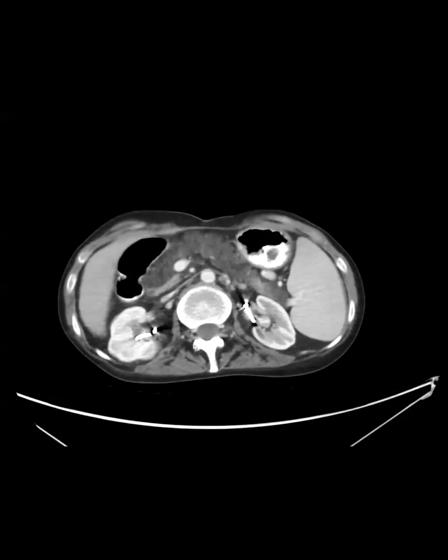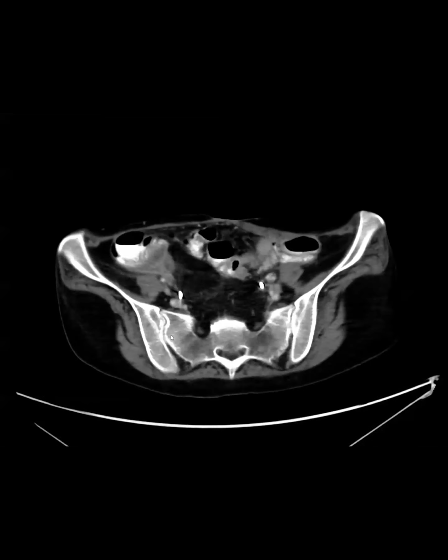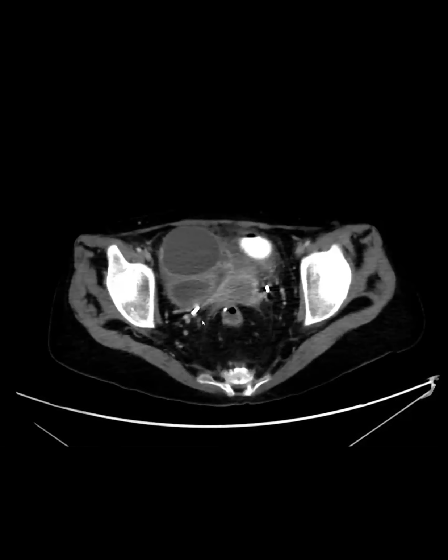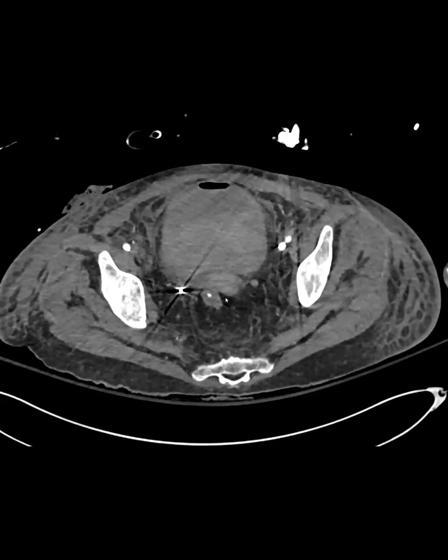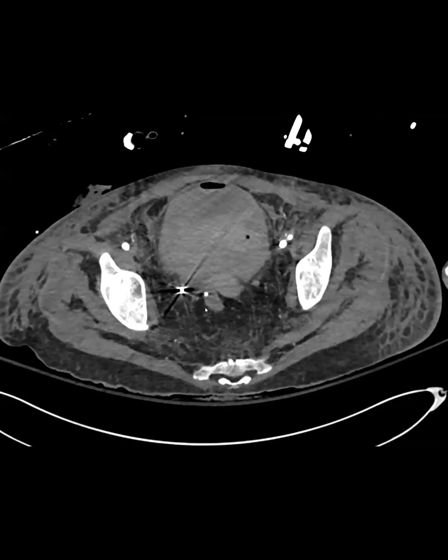You can see the kidney is a little bit, this was a while ago. They've got chronic bilateral ureteral stents. These are not resorbable stents, and that is an interesting point I may make later. Now we fast forward 2 years, and they had a florid UTI and underwent stent replacement. After stent replacement, they had massive hematuria. You can see there's a lot of blood in the bladder. The stent is still in place.